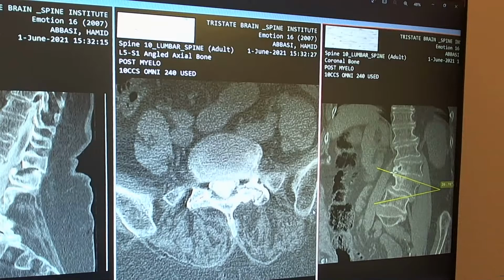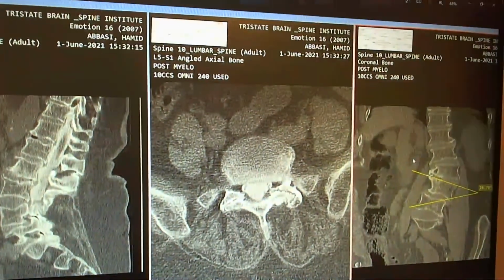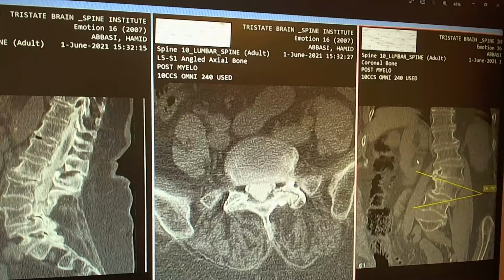Neil is saying that is where the term nuchal rigidity comes from. When your nuchal muscle goes into spasm, that's where the term nuchal rigidity comes from. Are you able to see this picture, the entire coronal view here? Let me maybe turn it a little. Maybe that's a little better.